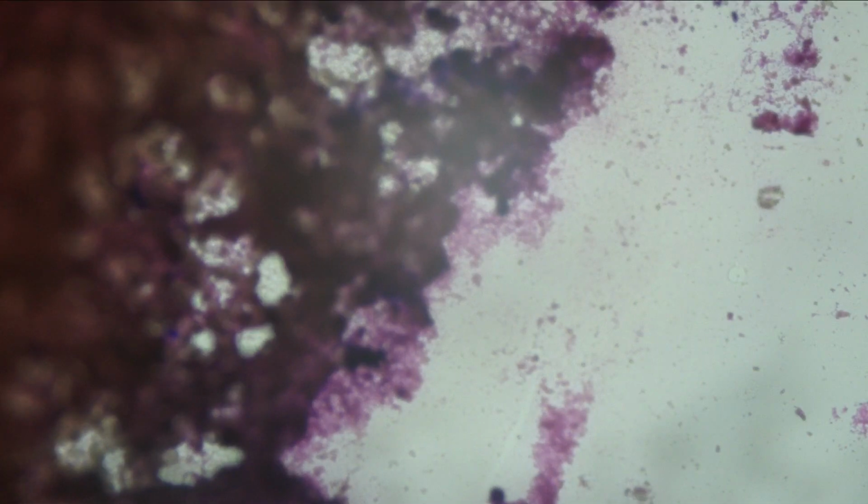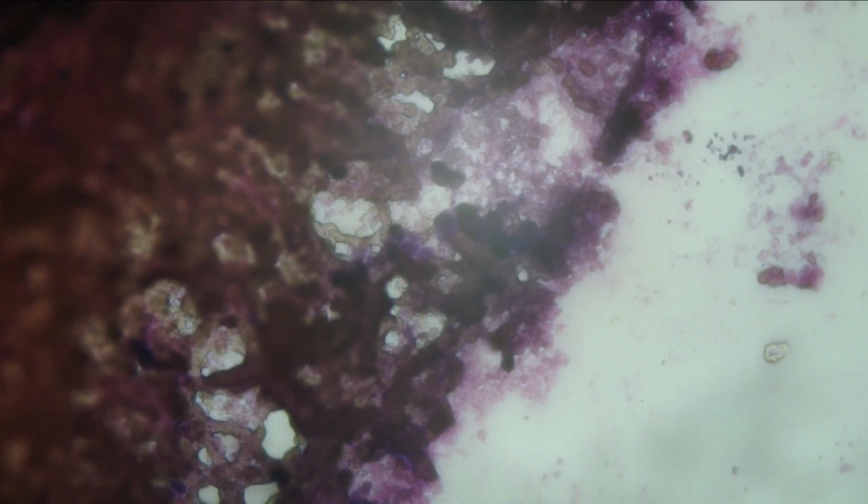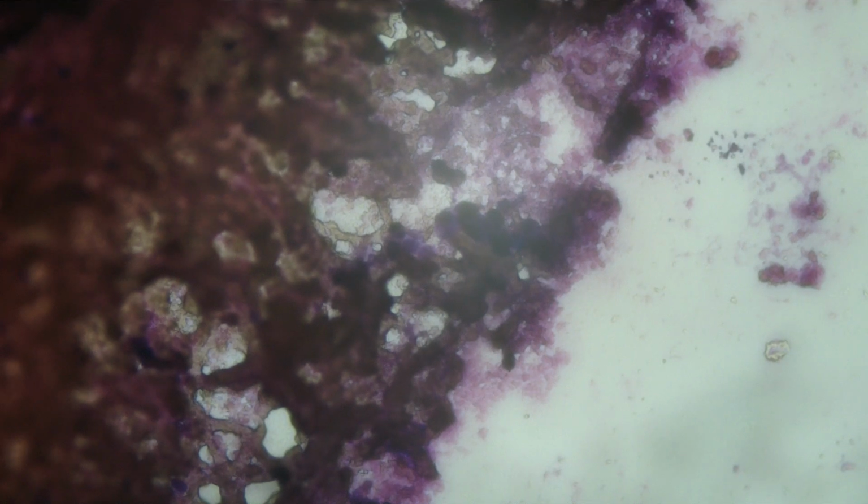So you see some cells there, but not much. What you see is like a branch or fibrosis right into the center, and the cells would be attached like grapes attached to a vine. So that favors a solid pseudopapillary tumor.